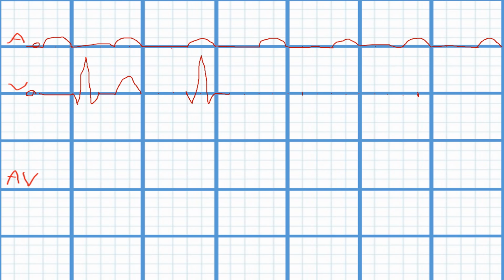1 little block over. All right, up to 0.2, down to 0. We keep going over here. All right, down to 0.1, negative 0.1, up to 0.4, down to negative 0.1, up to 0. All right, now we'll go over 1. All right, so this is going to be 0.2, down to 0.